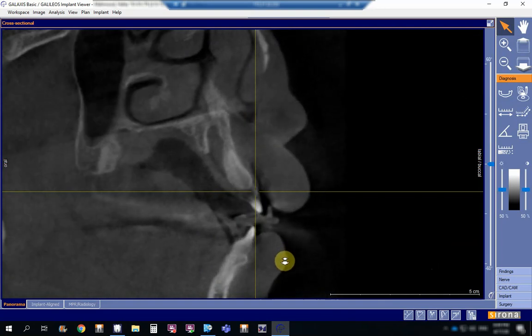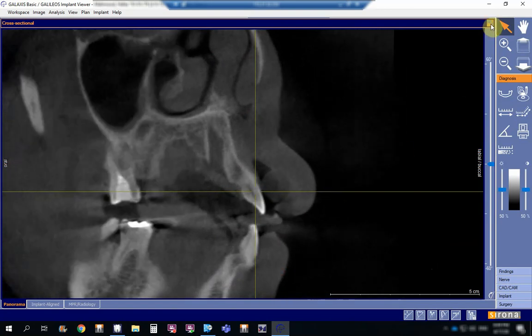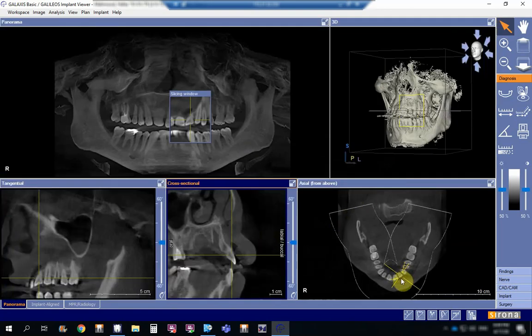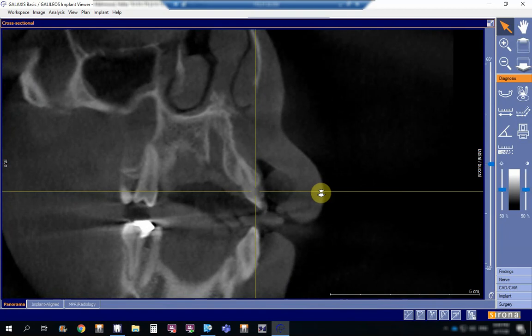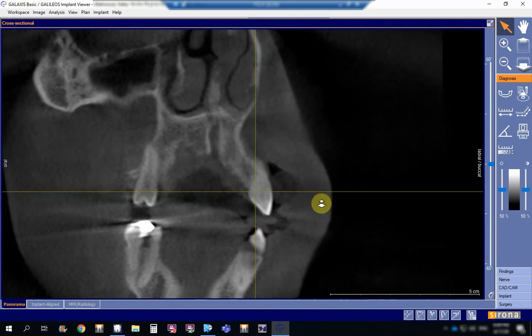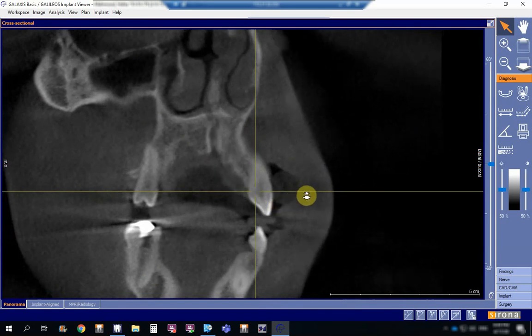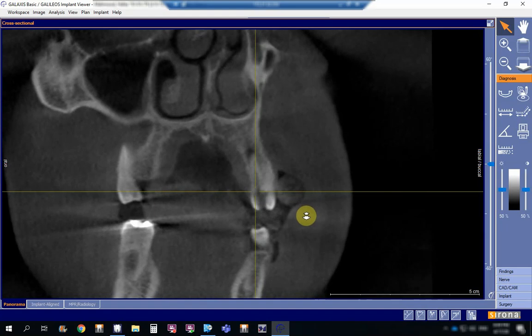The central is gone. Now we will start with the lateral incisor. Let me take you back here again. We have started, as you can see, with the lateral incisor over here, and then when I go more posteriorly, this is the distal of the lateral, and then we are in the mesial of the canine. See, now it is becoming more or less understood as if we're looking at the patient from the front, and then we're going more posteriorly. This is the distal of the canine finished, and then we're going to start with the premolar.